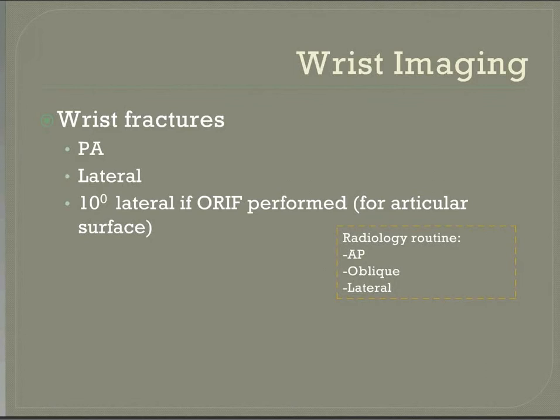Then it comes, I'll just show you those two. So the PA wrist, pretty standard.